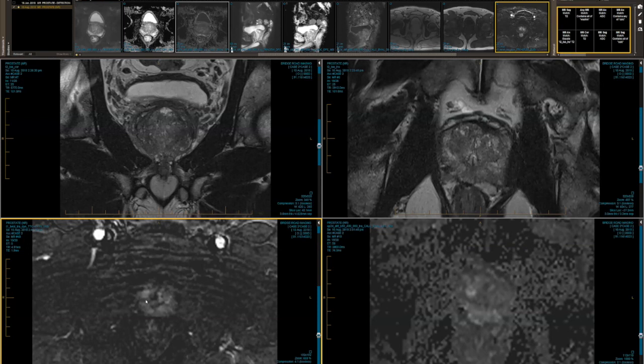Claire, I've just looked at the histology, I've got my microscope next to me. It's the opposite. It's actually transition zone based and aggressive and trickling into the peripheral zone. Interesting tumour. So this is just before we move to the final case quickly.